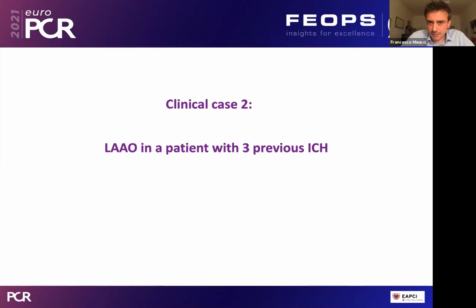And the beauty of this combination of the simulation software and a device that has a wide overlap of choice of measures is that if you change your idea at the last minute because you see a bigger or a smaller appendage than you predicted, maybe you can use the same device, because this device can be deformed, as you have seen, from 10 to 30%, and this is again a step forward in the way we live the procedure.